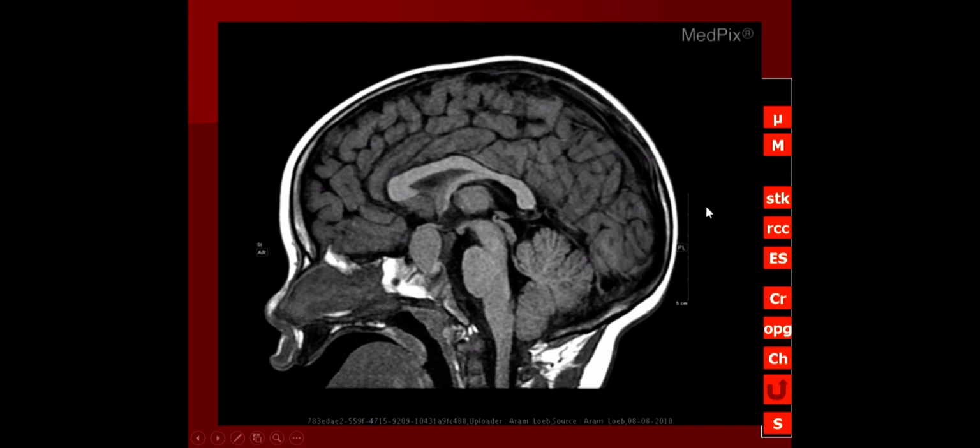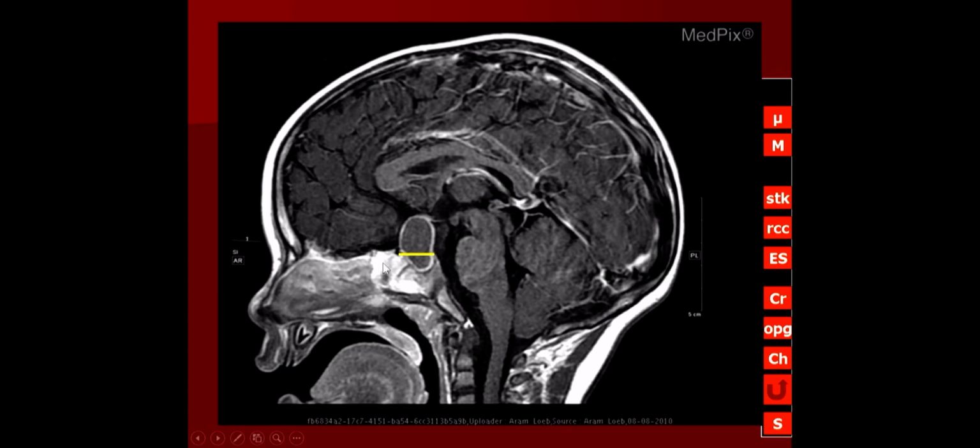When I learned about craniopharyngiomas, I learned that about 75% of craniopharyngiomas, which we think start as a suprasellar mass, actually grow into the pituitary fossa, 75%. So when it really is arising above the pituitary, it may grow into the pituitary fossa like it does in this patient. So that is roughly the orientation of the diaphragma sella.